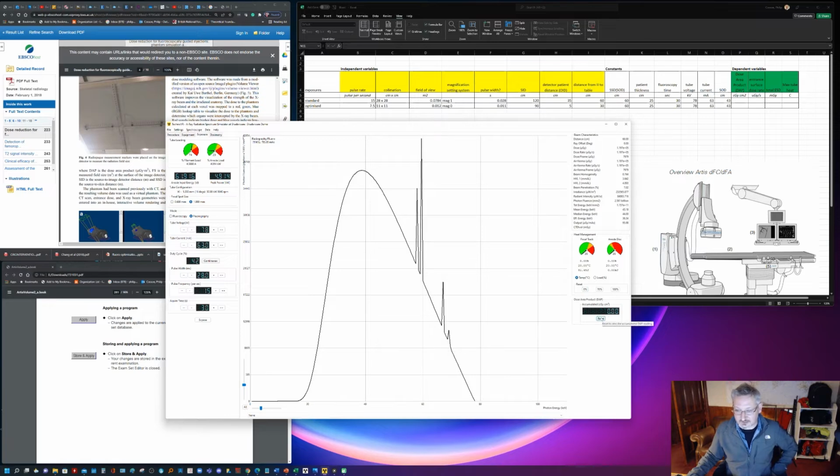Okay, I'm going to reset the accumulated DAP as well. So we're going to get our temperature from here, and we're going to get our accumulated DAP from there, and our dose per second is already displaying here. That's what that's set. So I'm going to run this now. Let's hit expose. Off it goes.